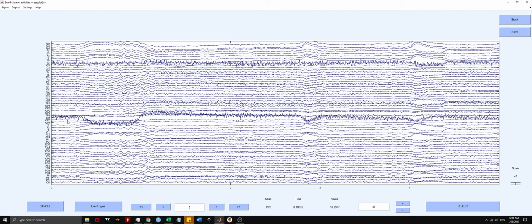This is because for many data types, the raw data isn't nicely positioned on the plot like it is here. Some of the lines won't even be on the plot, and so it would be very difficult for you to figure out which channel was bad. That's why I filter the data before fixing the bad channels.